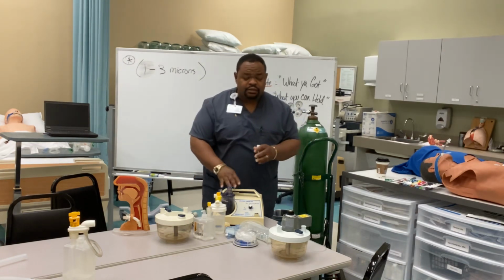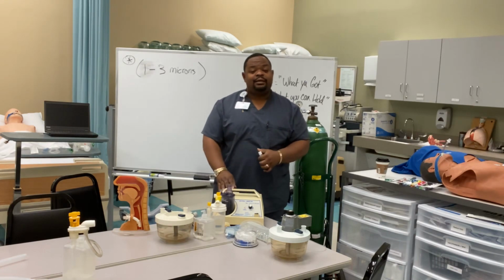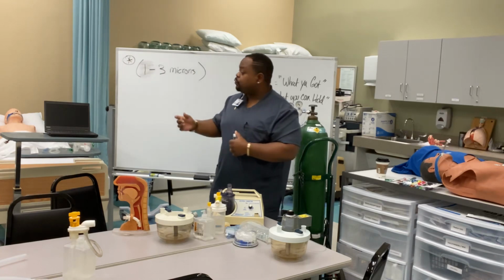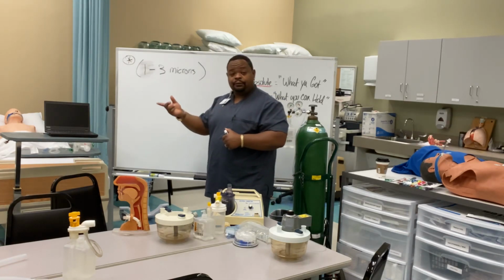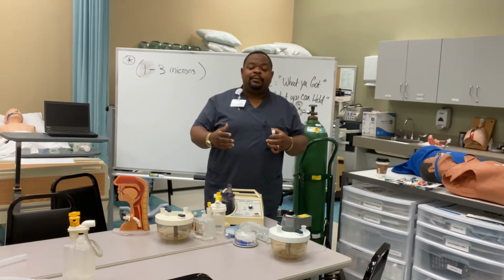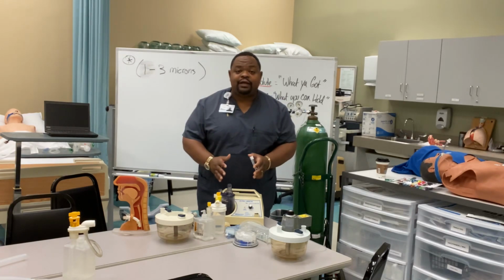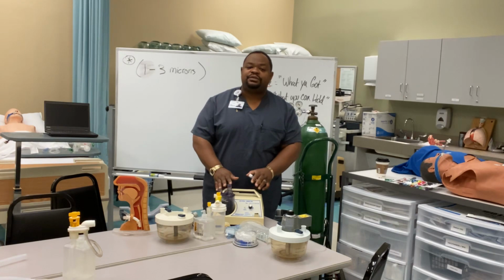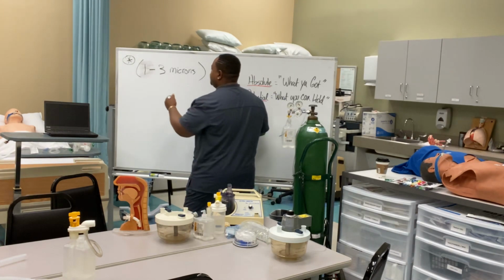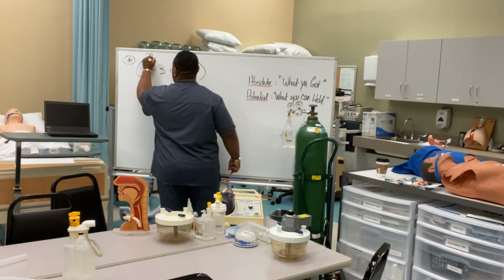So, ultrasonic nebulizers say 90% of our particles will be between 0.5 and 3, right? So that's good. I mean, 0.5 is a little small, but the majority of the particles coming out of this machine are falling in the therapeutic range, okay? So this is the therapeutic range.